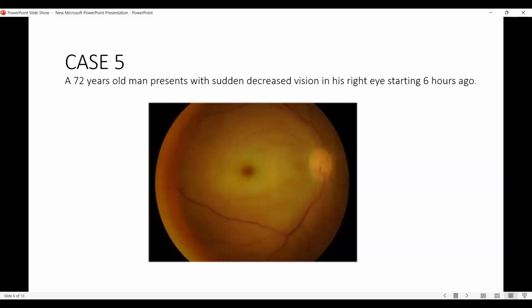Please focus on what is there. Like disc edema, if you say that it is there, there might be a controversy regarding that. I might not agree or somebody might agree. So do not go there. Just focus on what the examiner wants to see. The critical feature is what the examiner wants you to see.